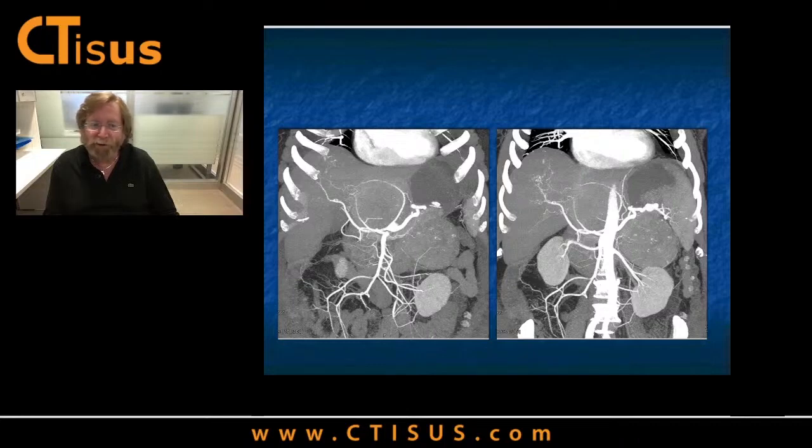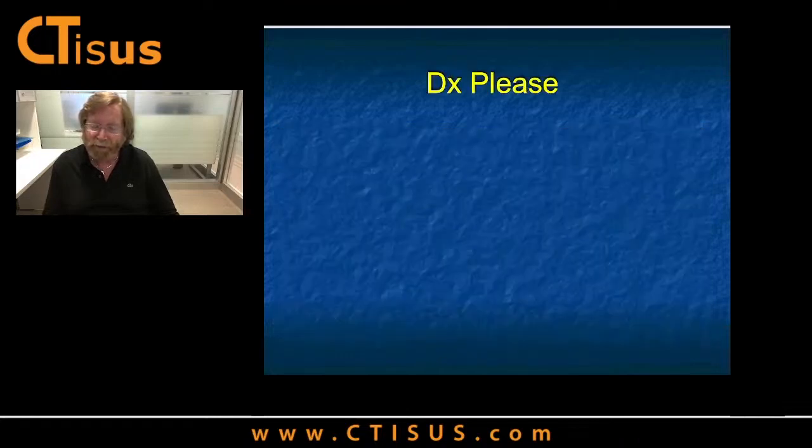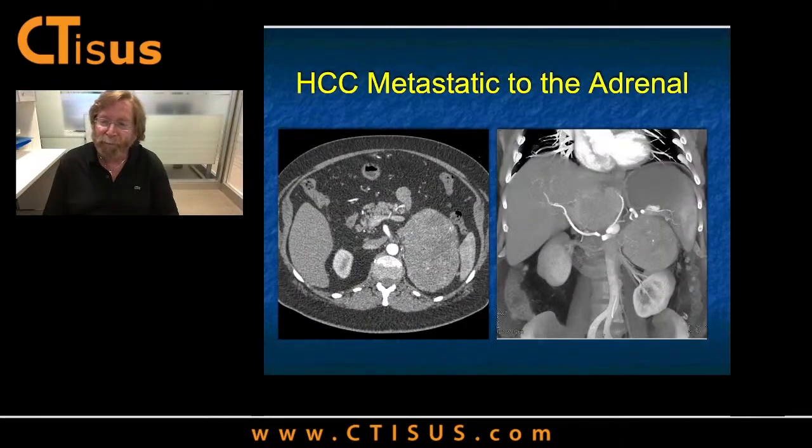Well, maybe you have a primary adrenal cortical carcinoma metastatic to liver, but probably more likely when you think about it, you better think, I'll give you 5 seconds, you're thinking, and hopefully you were thinking that this was hepatoma that explains the neovascularity metastatic to the adrenal gland. What a terrific case. And for whatever reason, melanoma and hepatoma give the largest unilateral adrenal masses. If I have very large adrenal masses, and even unilateral, I would also consider lymphoma. So that would be another possibility.